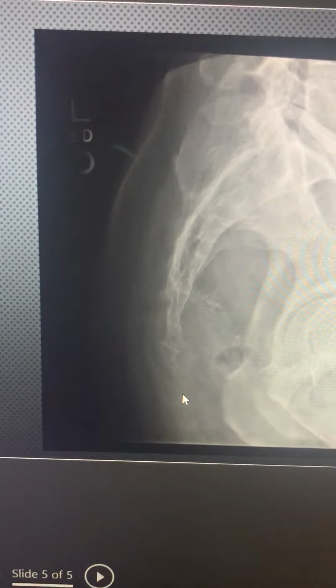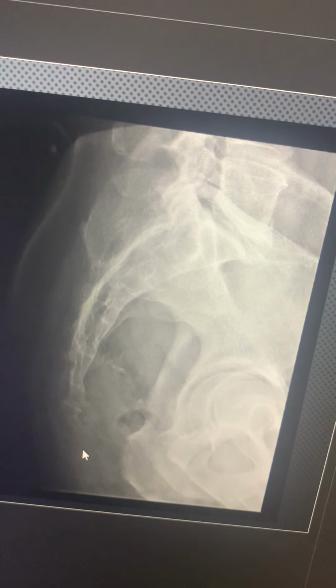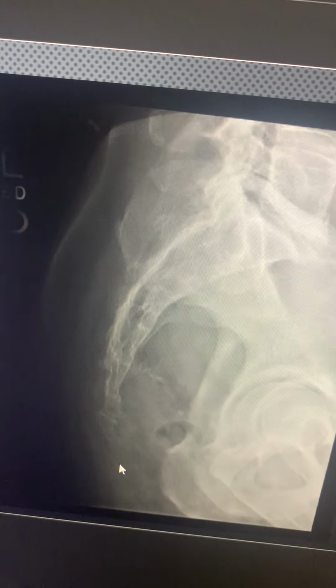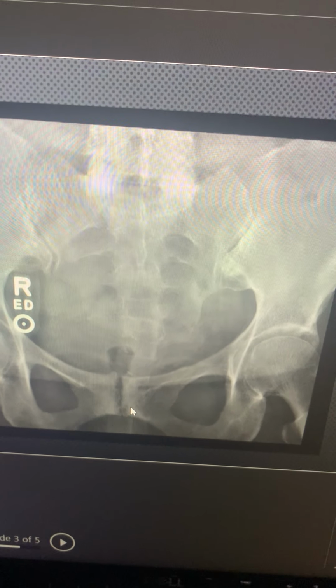I did shield the patient, but since we're dealing with the reproductive organs and it was hard to shield anywhere, I just shielded long bone to try to save any kind of dose that I could. Collimation on this one could have been a lot better on a repeat, but it wasn't enough to repeat it since we do have sacral foramina and all that.